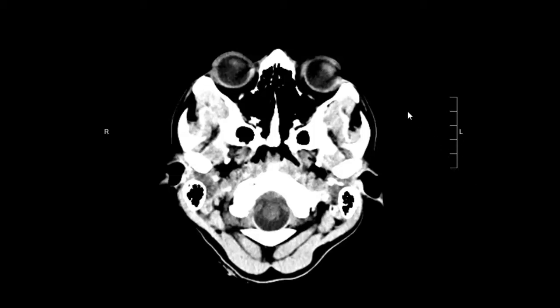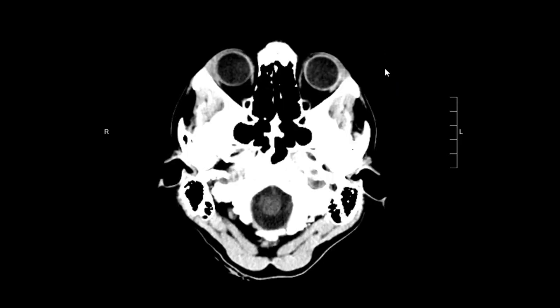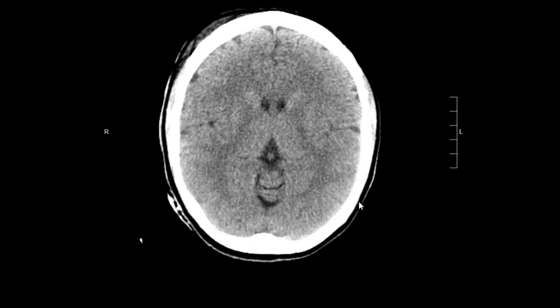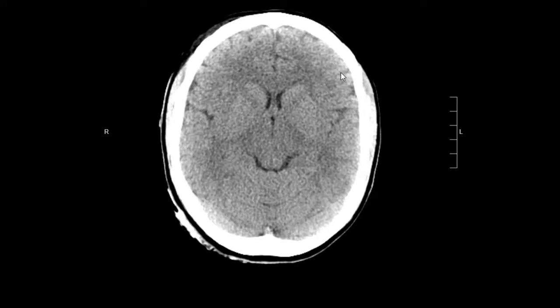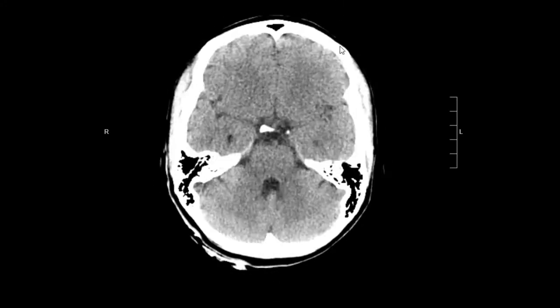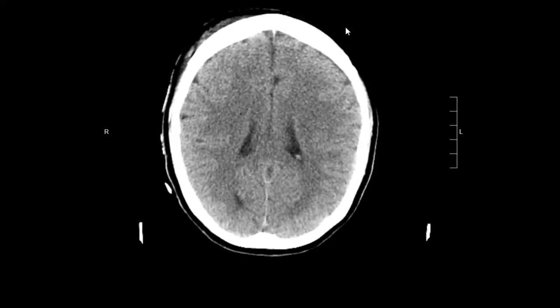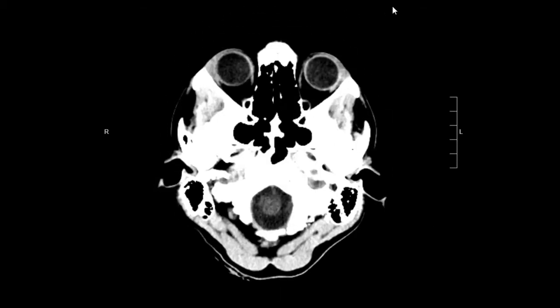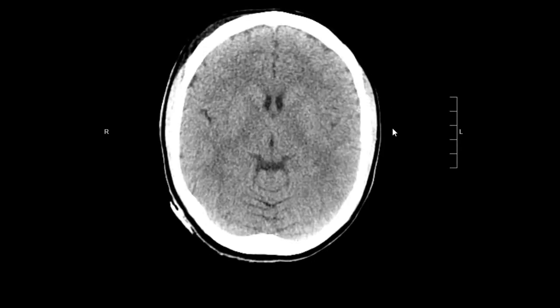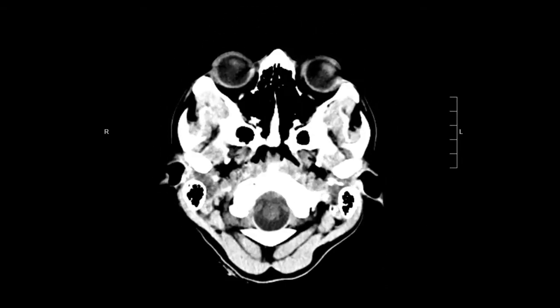Hi everybody, in this video we're going to be going over a nearly normal CT exam of the head. This is a case of head trauma, and so the question is: is there intracranial bleed or any kind of serious trauma that the patient and the physician need to be aware of? So the first thing I do is quickly take a look through the exam to look for any obvious abnormality, and nothing pops up on the first scan through.